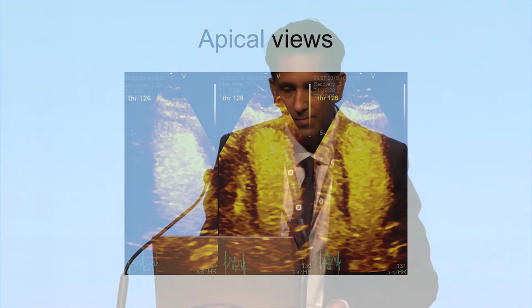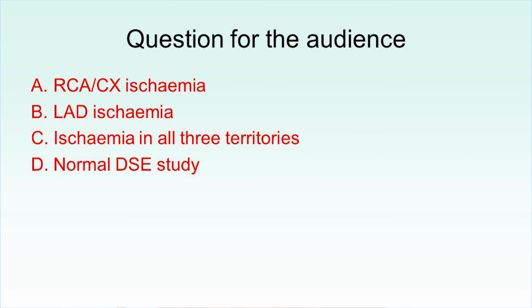So a question for the audience. RCA circumflex ischemia, LAD ischemia, ischemia in all 3 territories, or normal DSE study. Yeah, so LAD, from what we've seen, I would have definitely put down LAD ischemia, but we went on to do the angiogram. This demonstrated something different.